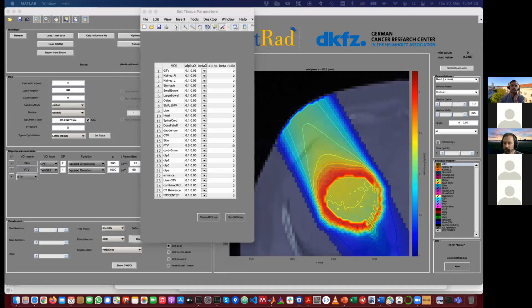I guess that's about it. I've added one optional thing: you could now also combine this with setup uncertainties, uncheck the isocenter box and shift the patient in addition. This is just optional, a suggestion if you want to combine some of the knowledge.